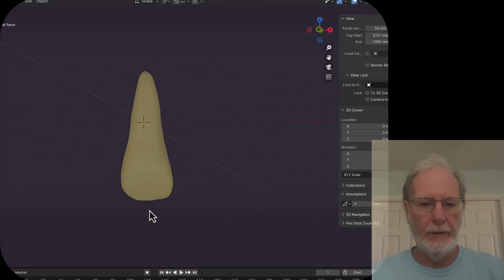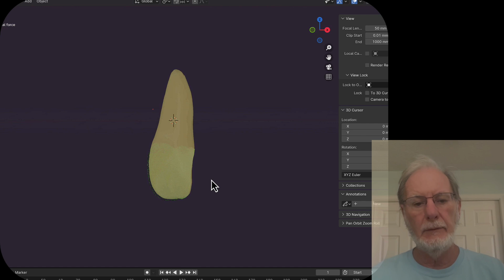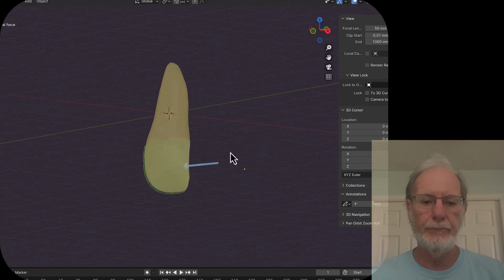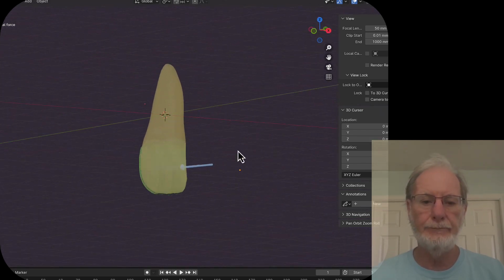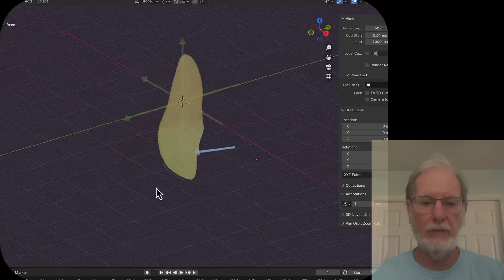Let's have a look when we place an aligner on a single tooth, like this one, and the aligner will be pushing against the tooth from the lingual. So we have a push force. What does happen when we look at the 3D axis of force application?